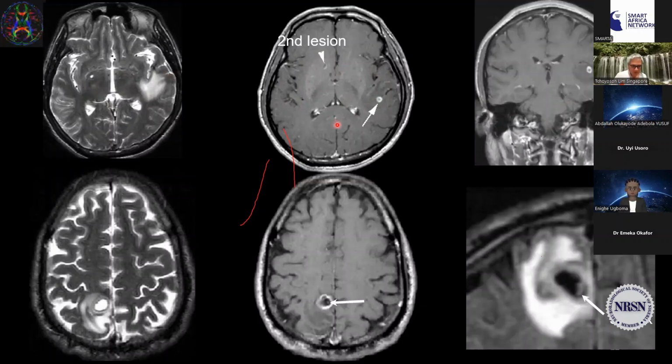cysticercosis. It's a different patient, again with a ring-enhancing lesion surrounding edema, and on some thin section flare studies, you can see that there's a scolex in the periphery of the rim that gives you some indication that this may be cysticercosis scolex.